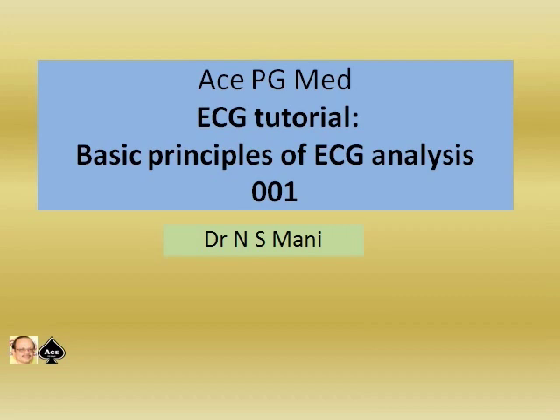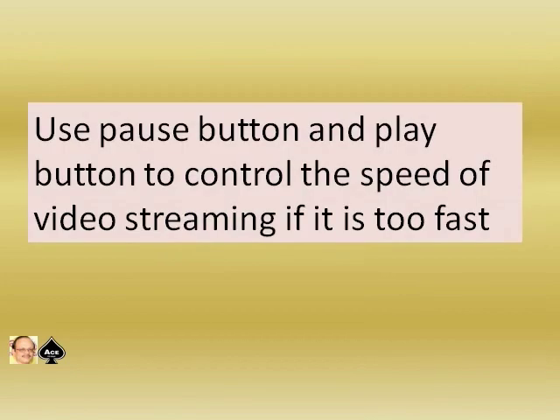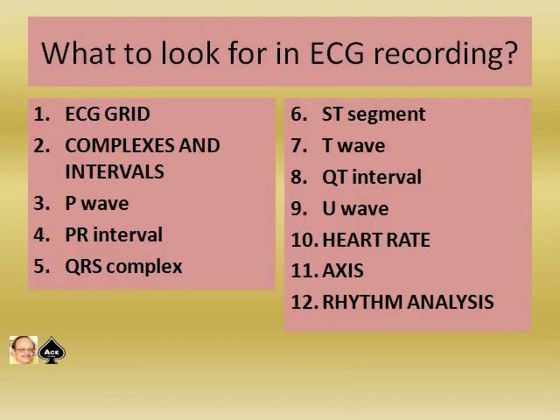In this video presentation, which is a series of videos, I am going to deal with the basic principles of ECG analysis. You can use the pause button and play button to control the speed of the video streaming, if the video is being played very fast, so that you can follow the visuals.